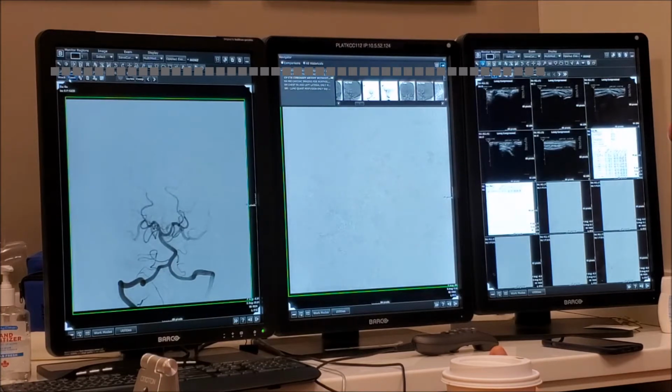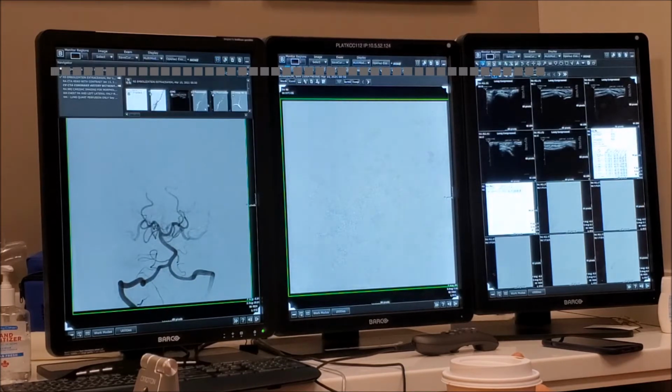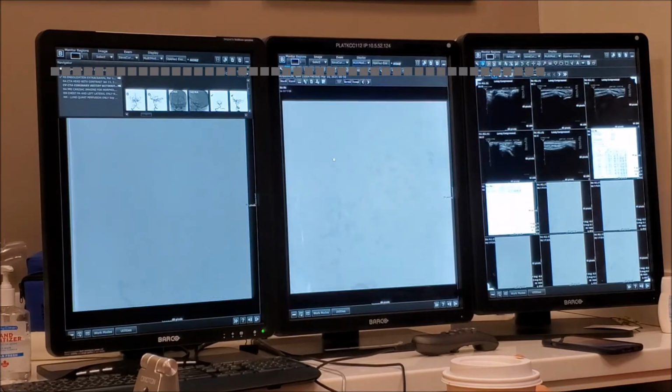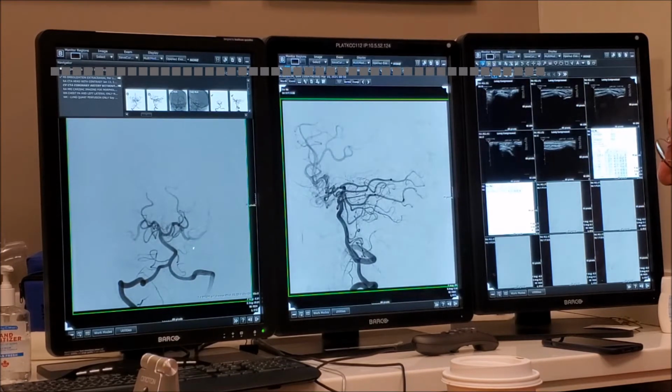Let's try to... So you would say the right vert is dominant because of the way the VB junction has been positioned? Once again, let me see if I can make this. Okay. So let's see. Let me see if I was able to coordinate it. Put this one here, and now they should be together. Ask me the question again. So you say the right vert is dominant because of the VB junction? No, it's just dominant here.